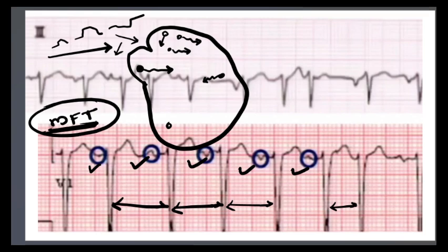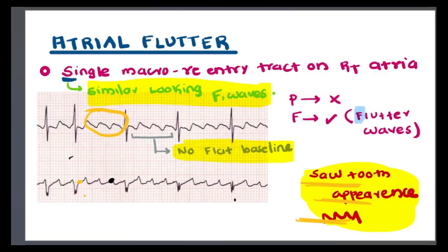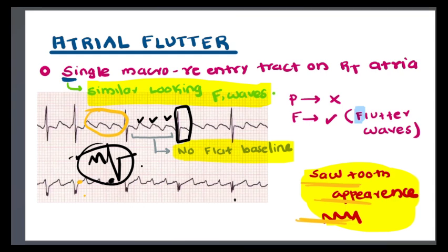So we have finished, and a few more details that I would like to add is that usually in atrial flutter, sometimes it follows a pattern called a 2 to 1 pattern. A fixed pattern, maybe 2 flutter waves or 3 flutter waves, then 1 QRS complex. So this kind of pattern can be seen in flutter, or it can be variable, sometimes 2 flutter waves and QRS followed by 3 flutter waves then QRS. But a fixed pattern is more common.